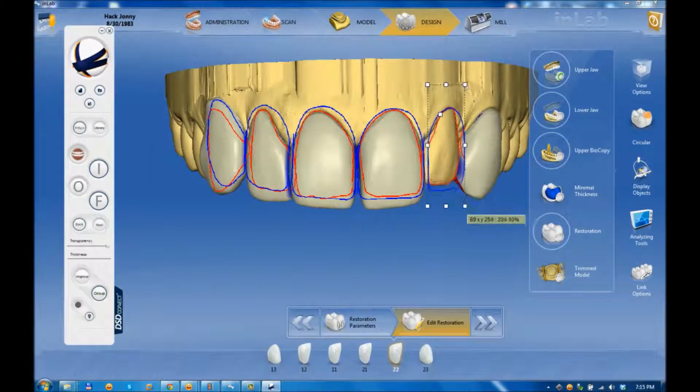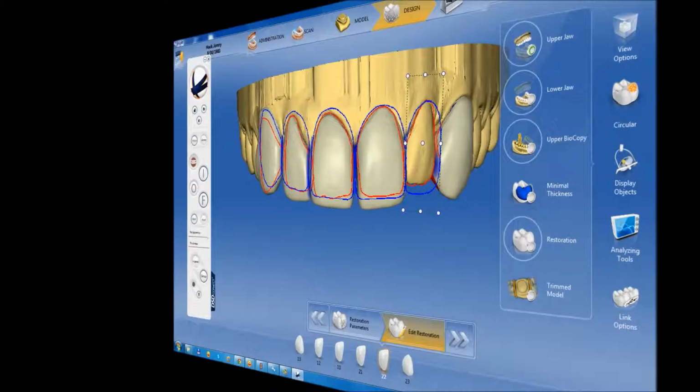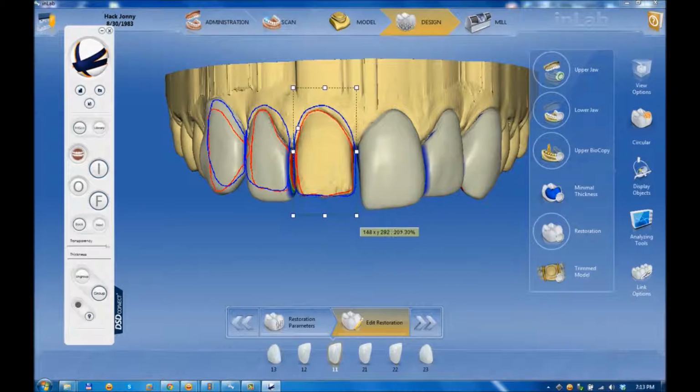Modifying the dimension and rotation is done from the points of the selection's edge, and changing the center for resizing or rotation is done from the reference point in the center of the selection.